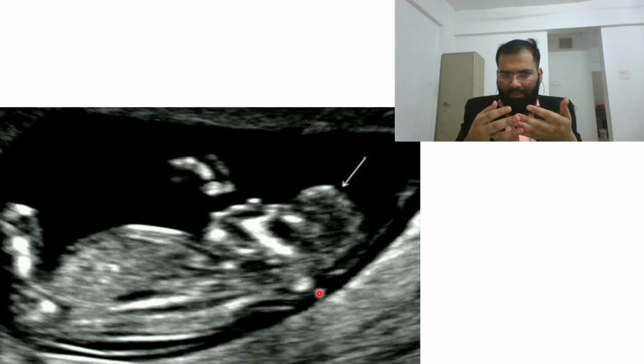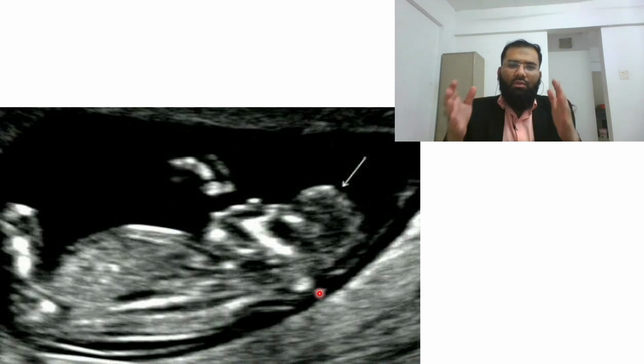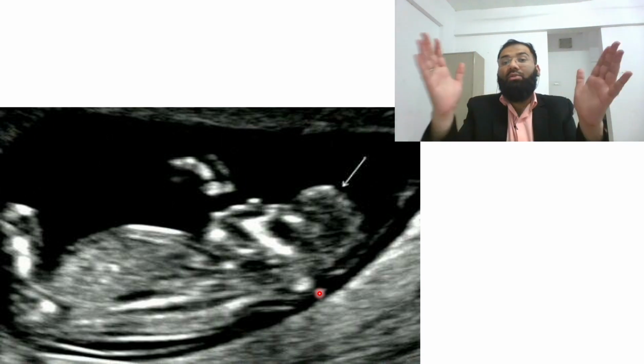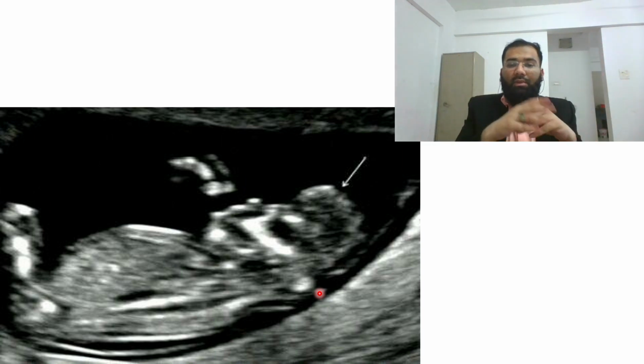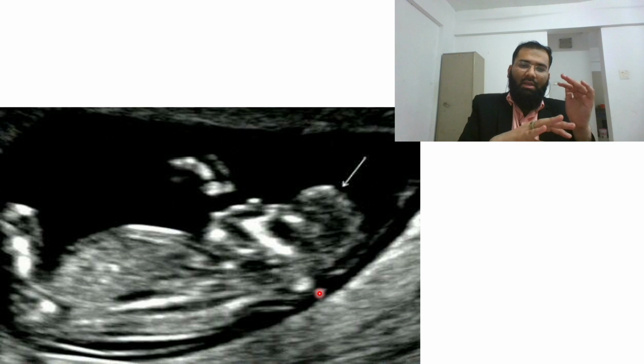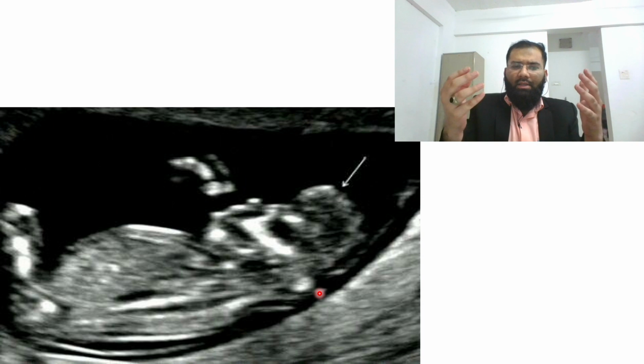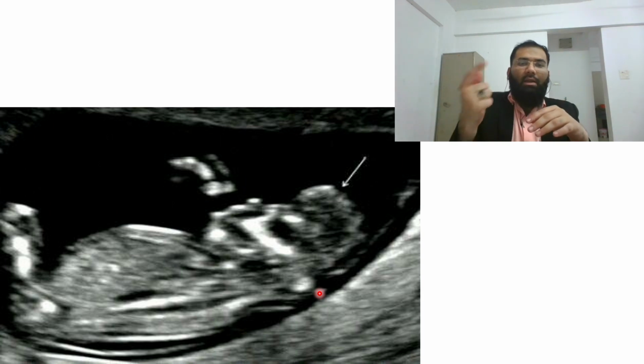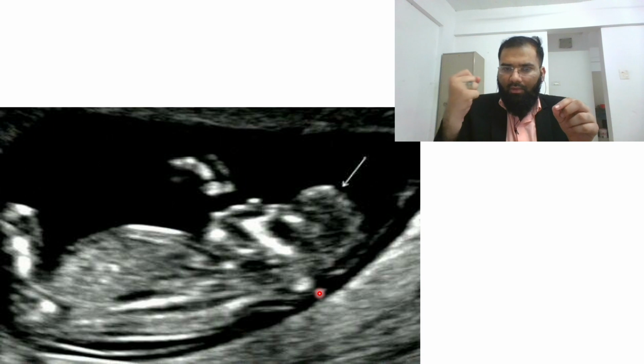Because sometimes a patient might come for a viability scan, and our duty is not just to look for whether the fetus is viable or not, but at the same time we should always keep our minds and eyes open and try to look whether the fetus is anomalous or not. And anencephaly is one such anomaly which is picked up very early at around 11 weeks. In fact, it is the first CNS anomaly that can be picked up at around 11 weeks. So you need to carefully screen for such important findings. They should not be missed.